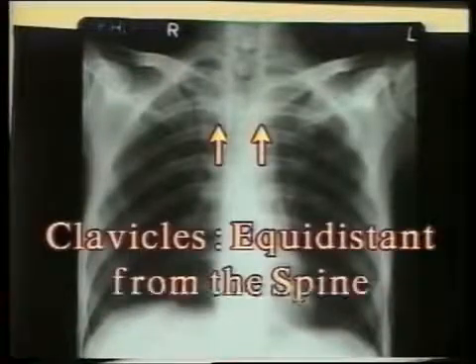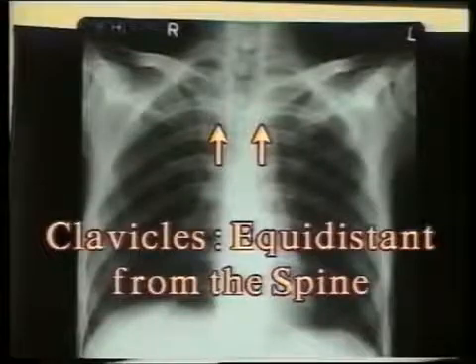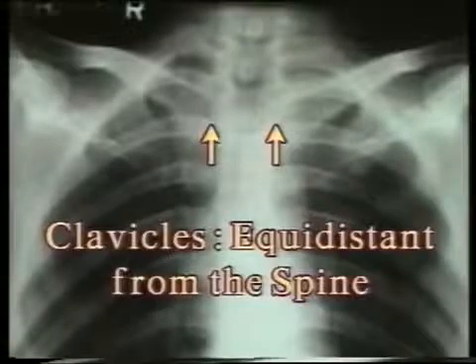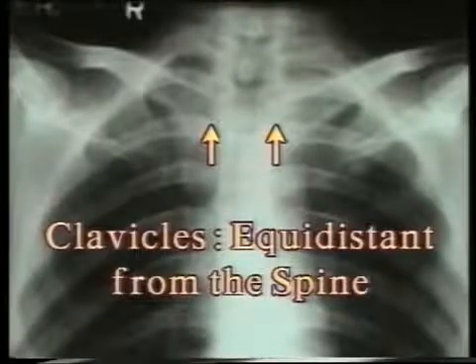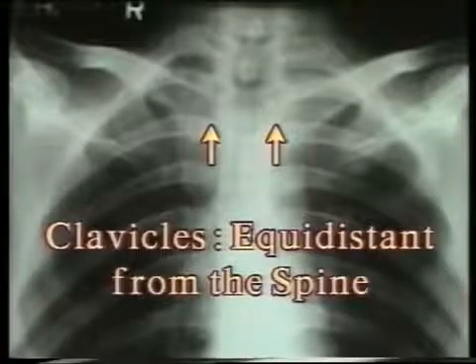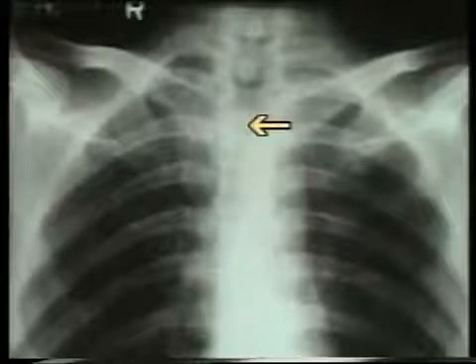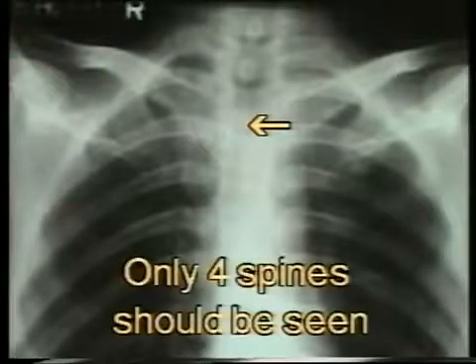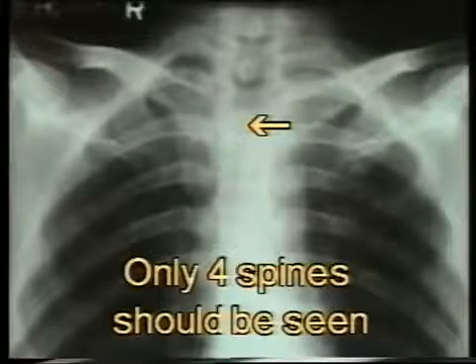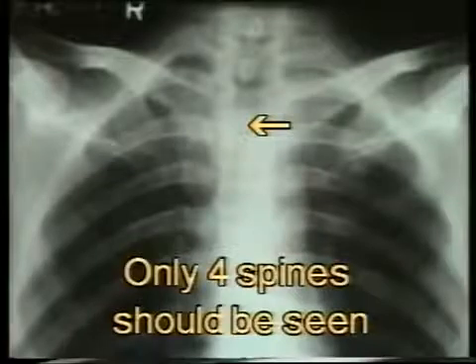In a well centralized film, the medial ends of both clavicles are equidistant from the spine. If they are not, then you cannot make any comment on the mediastinal shift, cardiomegaly, or on comparative radiolucency of the lung fields. In a well-exposed film, the spinous processes of only the first four thoracic vertebrae are seen. Others are hidden by the heart shadow.